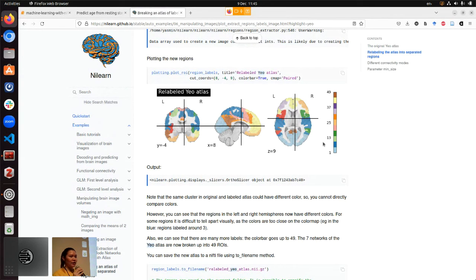So if you really care about the connection of a very localized brain region, you will need to pass through this separate function to separate the ROIs. But it is a perfectly valid analysis choice to use the signal from a network. It is perfectly fine, because in that case, the feature you're interested in is the collective feature within that network, rather than a very local region.